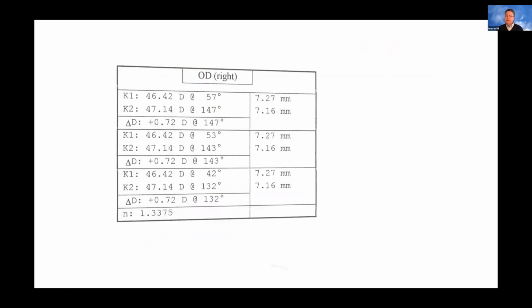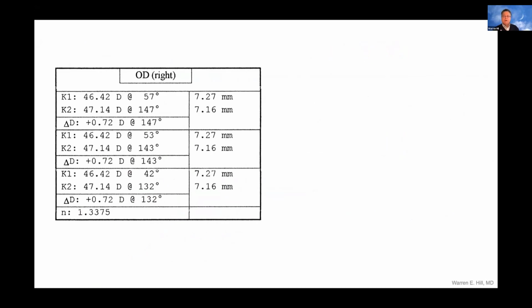So you might say, well, why do we need to go to all this trouble? You know, why would my keratometer measure any place except in the right area? Well, if the astigmatism is asymmetric or irregular, that may happen. And here's just another example using the IOL Master. This is from, I think, software version 5.4, which a lot of people are using right now. And it's helpful to keep in mind that astigmatism is a vector, which means it has magnitude and direction. And we can have a refractive error following toric IOL placement with an error in either one of these.